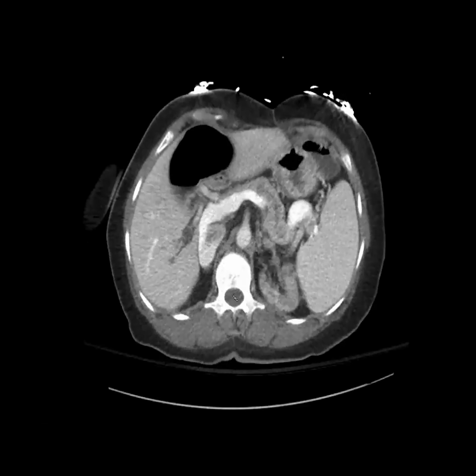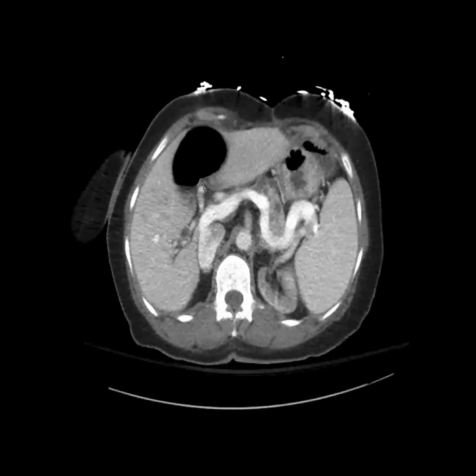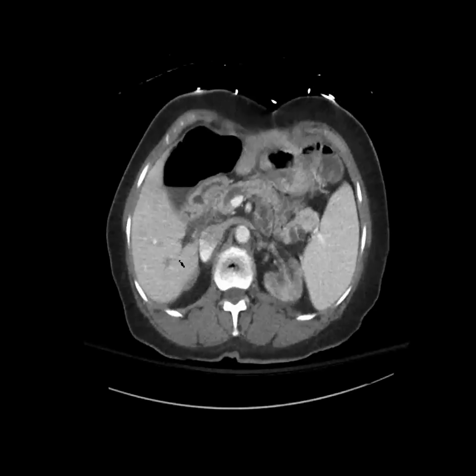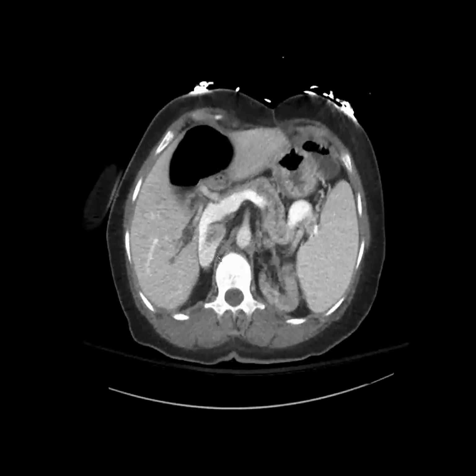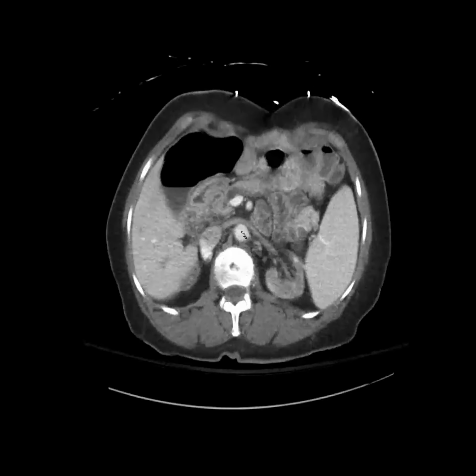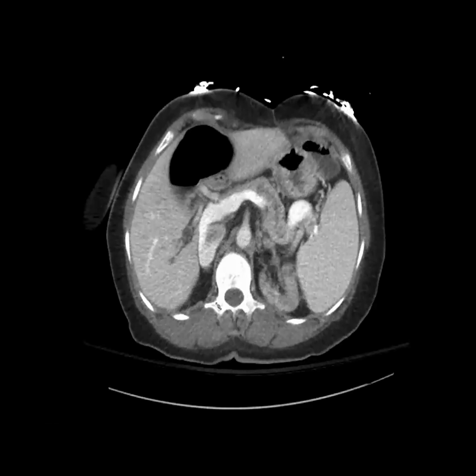There's no portal vein, and it kind of looks like there's an enlarged hepatic artery here. You don't really see all the tangle of vessels of cavernous transformation. And then there's another finding on this image here. The splenic opens directly into the IVC. Yeah, exactly. So this is the SMV splenic vein, and it's draining directly into the IVC. So do you know what that's called?